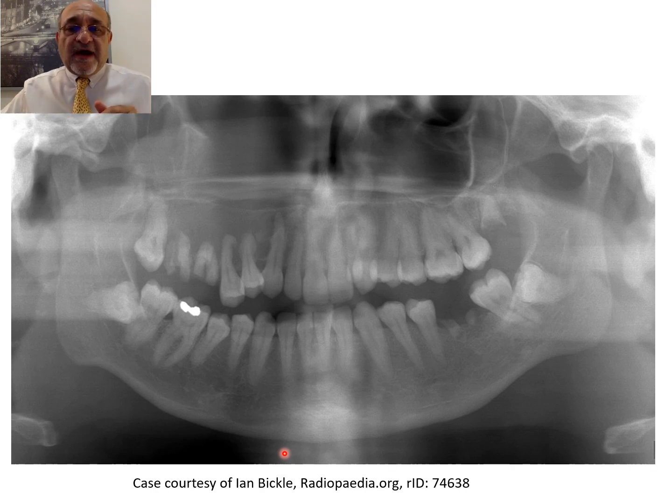And fourth, have a look please at the general pattern of the bone trabecules. The bone trabecules don't have the normal appearance which is seen in the radiograph. They tend to lose the general arrangement, and this is because of the loss and the continuous thinning and removal of calcium, so we don't have the normal appearance anymore.